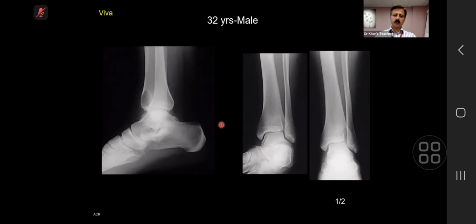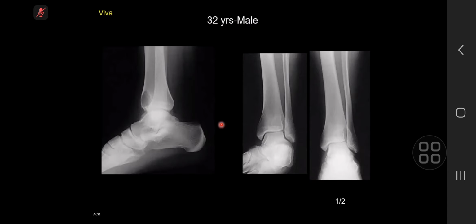Yes, please. So I've got frontal and lateral radiographs of the ankle in a skeletally mature male, and I can see a well-defined lucent lesion in the distal metaphysis of the tibia, which has a well-defined margin. There's no surrounding periosteal reaction. It does not cross into the epiphysis. It's primarily metaphyseal and eccentric in location. No periosteal reaction, no soft tissue swelling, and the underlying matrix does not have any calcification within it.